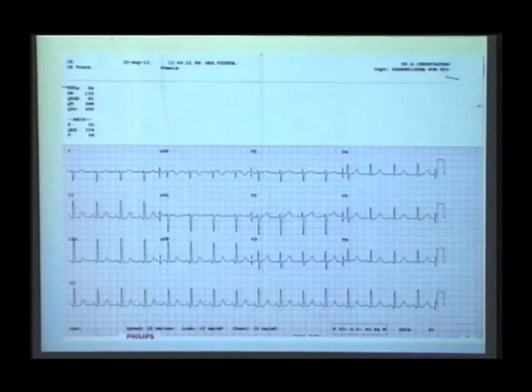So you can look at this ECG here. What is the axis? What is the axis number? 120. See, which lead confirms it here? Lead 3 is the axis. Which lead to look at to confirm? AVL is negative. You can see the initial positivity in L1 and AVL, initial negativity in L2, L3 and AVF, and the terminal positivity in L2, L3, AVF, with the R wave in L3 the tallest. So it results in right axis. So what's the diagnosis here?